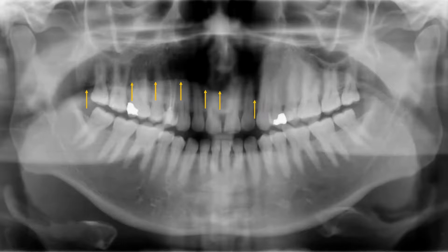In this example, during the exposure of the right side of the jaw, the patient did not put the tongue on the roof of the mouth. So we ended up with a very dark area around the midline of the upper jaw. We do not even see the apical regions of the anterior teeth properly. If there is a disease in this area, we cannot identify that. On the left premolar molar region, the tongue is in a better place and then it drops down again. So the patient tried to put the tongue in the right place during this part of the exposure.